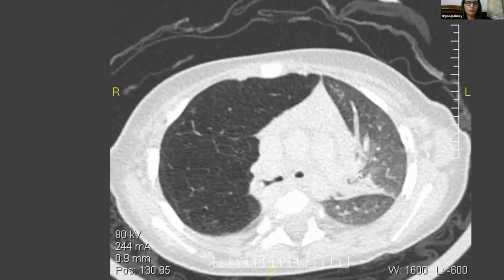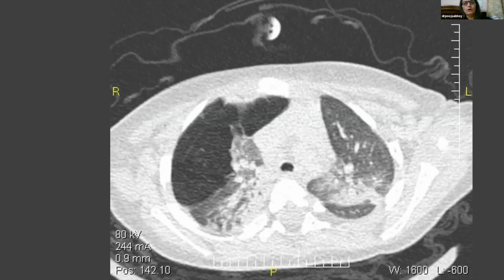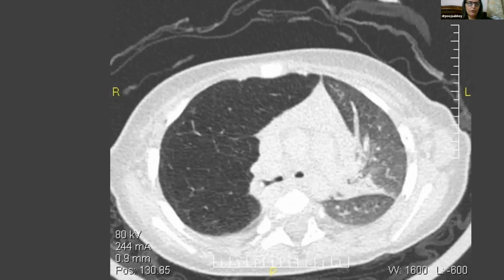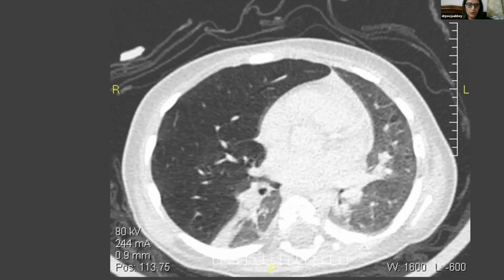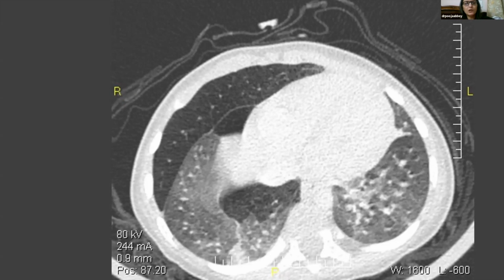On the lung window, we should always look at the airway as well, especially when we are dealing with overinflation. We had thought of possible foreign body. So we could not really see any definite foreign body here. So then the thought process was, okay, maybe some kind of congenital lobar hyperinflation, because we see that quite often at our institution, because the pediatric surgeons operate on these cases. So a lot of cases come.